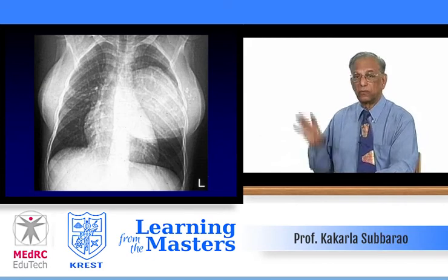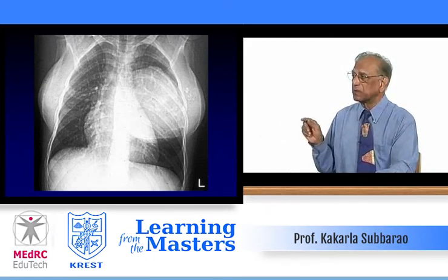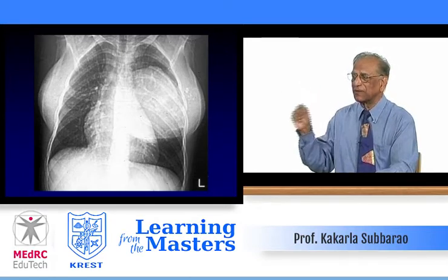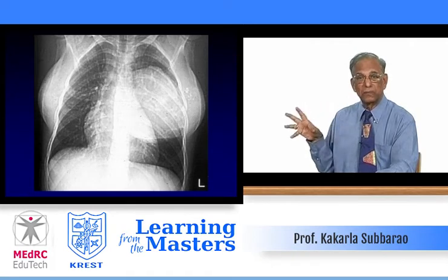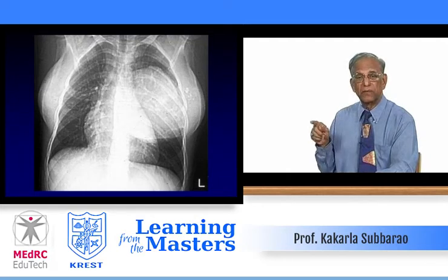And then, if you look carefully, this penetrated view shows some of the ribs, especially the fourth rib is eroded, and the anterior part of it is not seen. Even this mass has got a slight calcific rim. Unless you see closely, it may not be possible to observe this. So a calcific rim, erosion of the ribs. If it is the erosion of the ribs, it could be neurofibroma because it is arising from the posterior mediastinum. But there is a calcific rim. Neurofibromata do not calcify, nor do schwannomas.